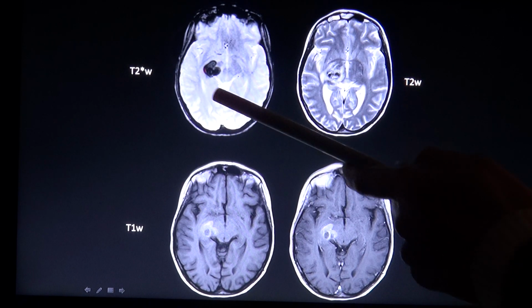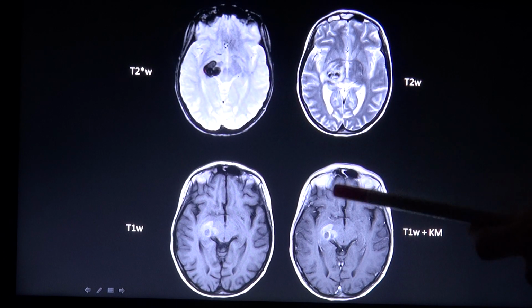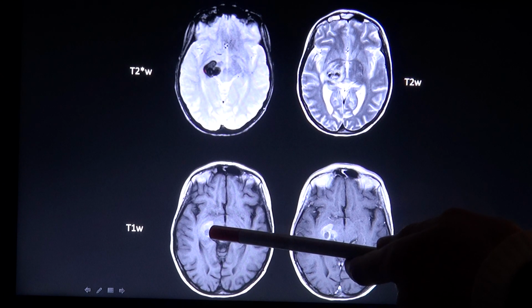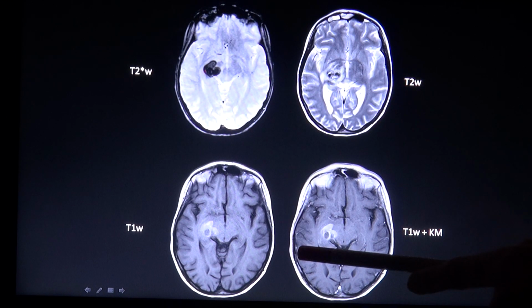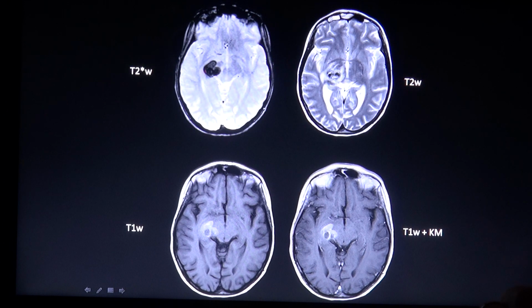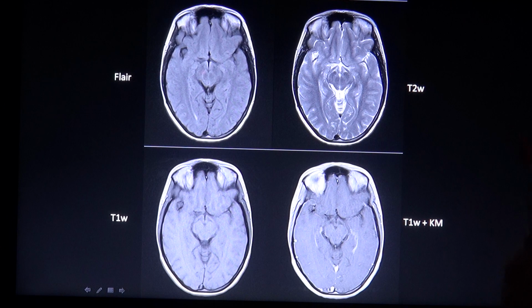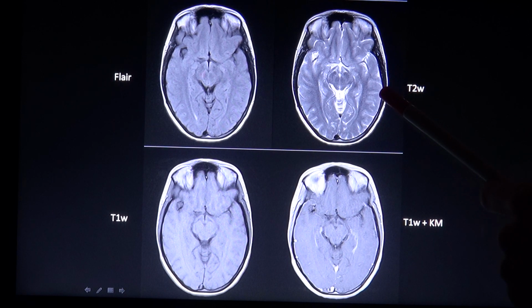The blood is really dark or almost black on this image, compared to a T1 where the blood is bright and the T2 where there is a mixed dark and bright lesion. So again, referring to the T2 weighted image, you also see dark objects like the gray and white matter, where the white matter appears a bit darker than the gray matter. Black on T2 is again air, dense bone or calcified lesions, same as with T1.